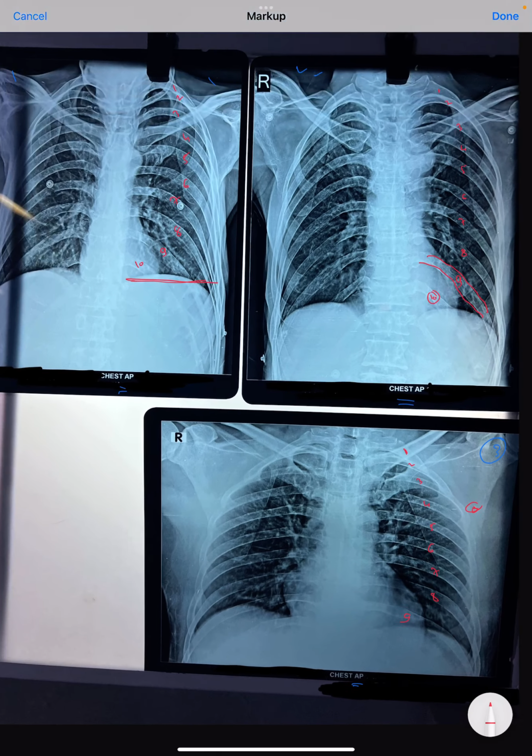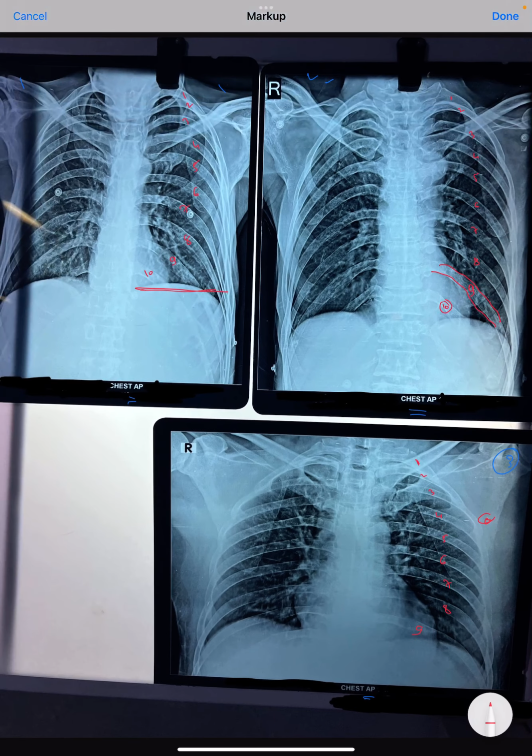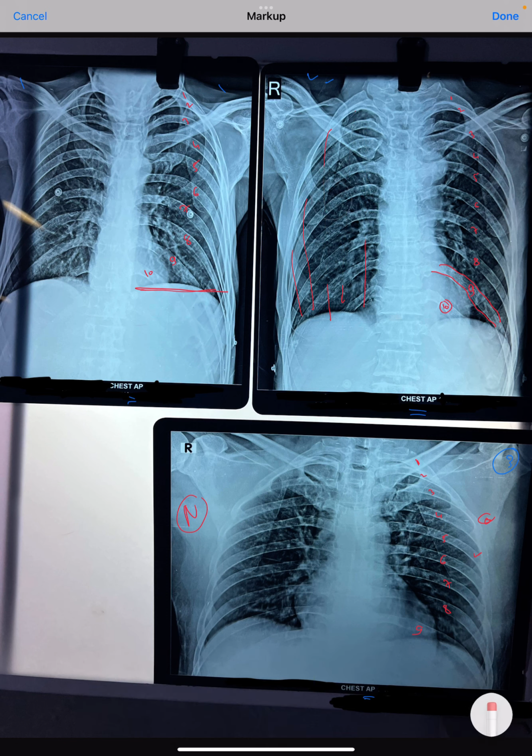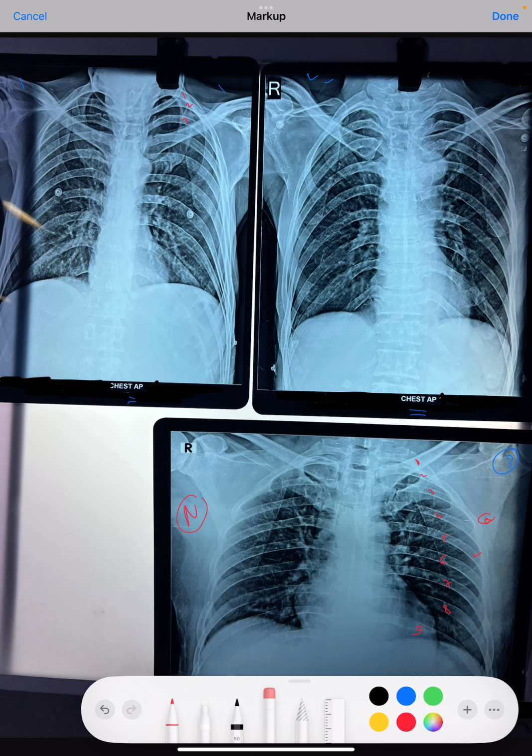In short, we cannot see two ribs here because this lung is more normal, whereas in this X-ray we can see the ninth as well as the 10th posterior rib, because these lungs are hyperinflated because of emphysema. In emphysema we have chronic irreversible damage to the alveolar units. That is the reason why lungs become so hyperinflated. We have other proofs for that also.